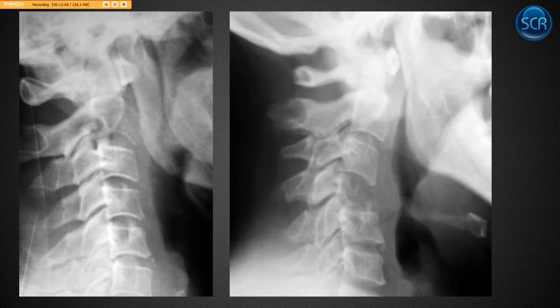Just a couple more neoplasm cases. Again, in this one, we follow George's line down here. Oop, we lost it right here. And we look at C2 vertebral body closer. It should look like this one. It doesn't because it's been destroyed. So this is lytic mets.